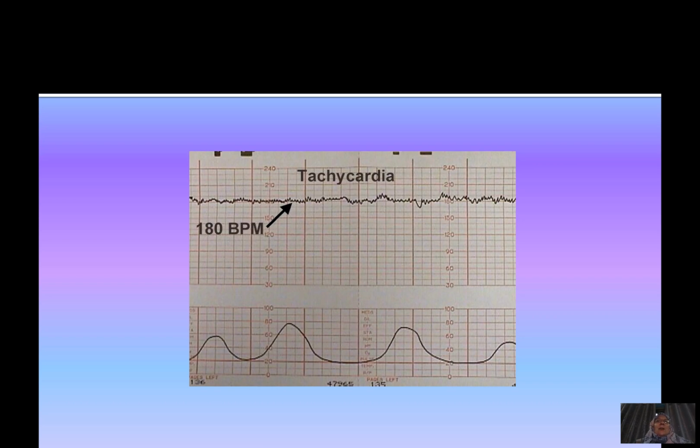So this is a picture of a CTG, and I know you want to say there's a tachycardia and it's labeled, and that's true. But I want to ask you to take a few seconds to look at all of the features that you can see. Here you start with the contractions. You see there are contractions there, 2 in 10 minutes. Then you see the baseline rate is 180. Variability appears normal to possibly slightly reduced. There's no acceleration and also no deceleration seen on the CTG.